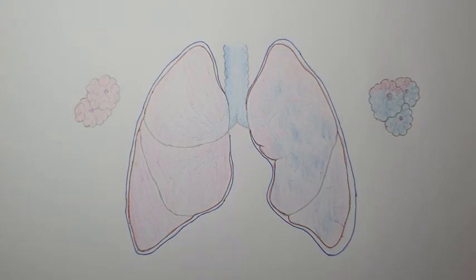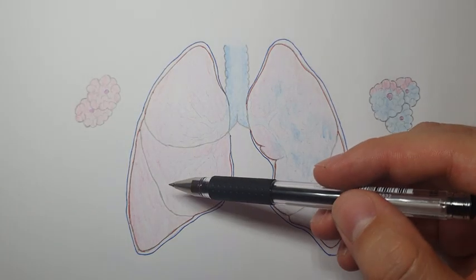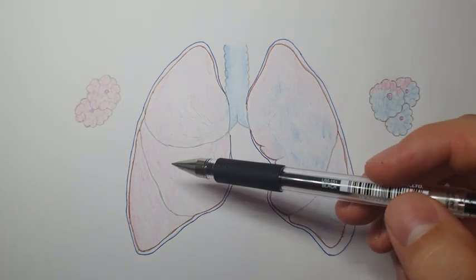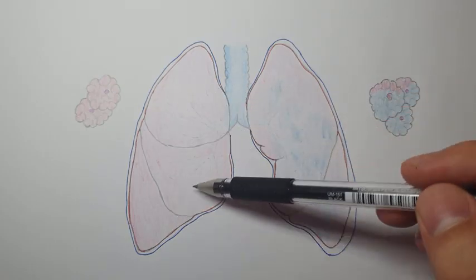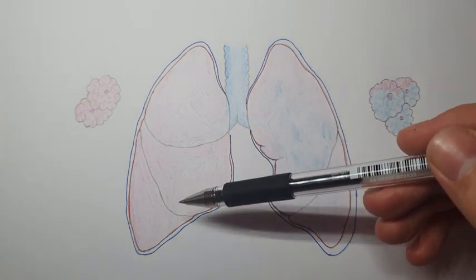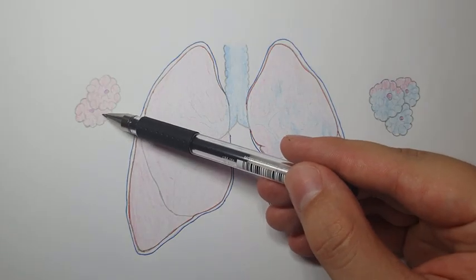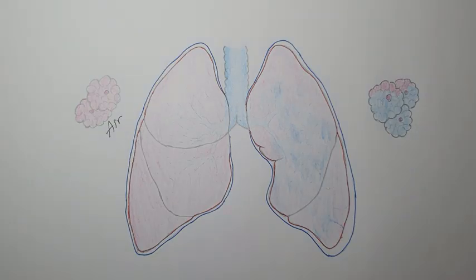Hello. So before we go into pulmonary edema X-rays, or before we show some examples, first we will analyze some important features. So here we have a normal lung field. We see the normal vascular marking and the normal tissue of the lung. And in this normal tissue, the alveoli are filled with air. So there is air in the lung tissue, or the alveoli are filled with air.